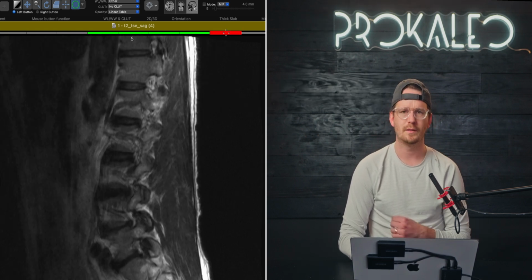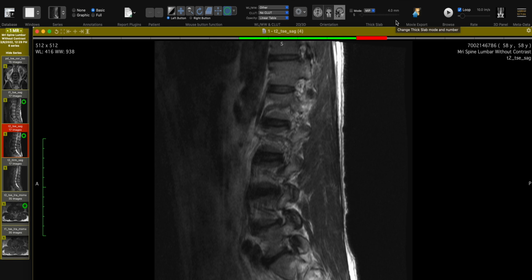It looks like he has a little bit of scoliosis too. And I'd say functional scoliosis, not structural. Structural is like what you're born with. Functional is like he's a golfer, soccer player, so he does a lot of left rotation. As a right-footed, right-handed person, a lot of left rotation. So his body's going to start to adjust to say, okay, dude, you're rotating a lot left. Why don't I keep you left rotated? That's called functional scoliosis. And I'm saying that because you can see that I can see part of his thoracic spine, but I can see a different part of his lumbar spine.